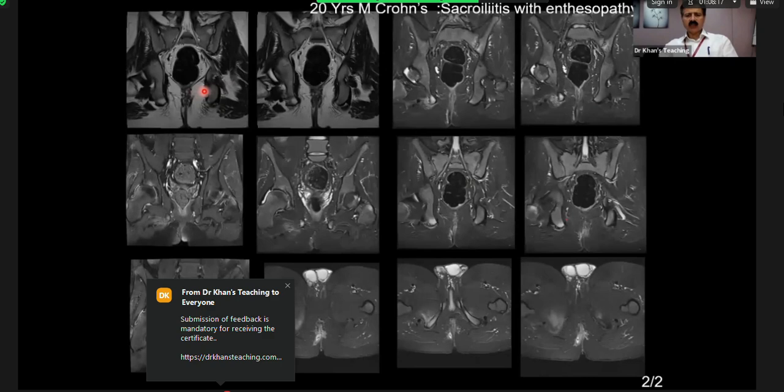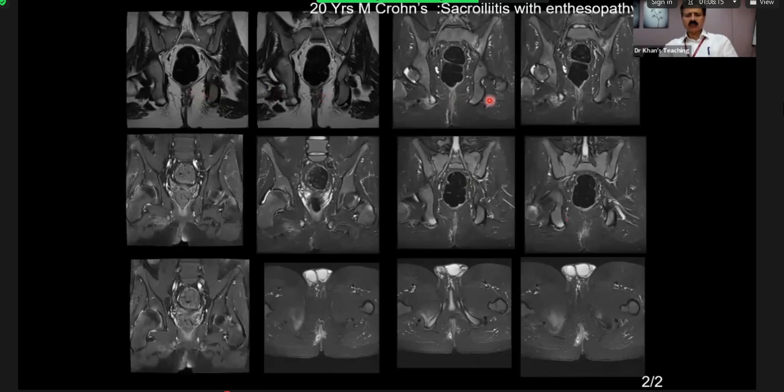This is a T1, then axial STIR, axial STIR, axial STIR. On these 3, this is the MR of the same patient as previously, and I've given you the diagnosis, right? What are your findings on these 3 axial sequences?